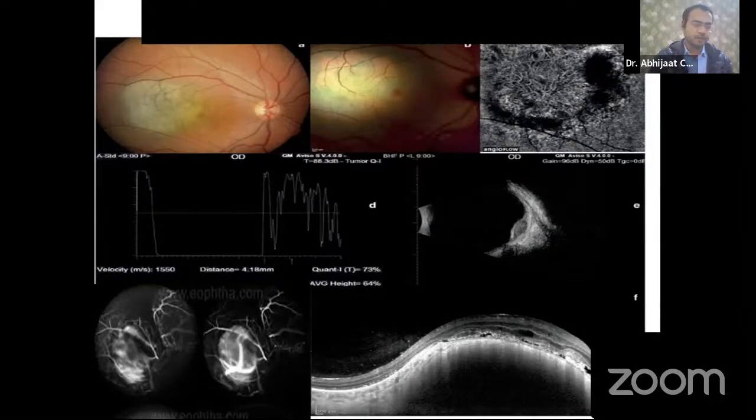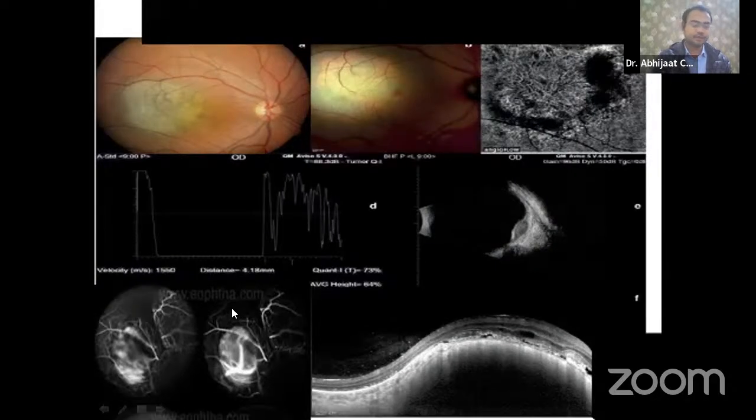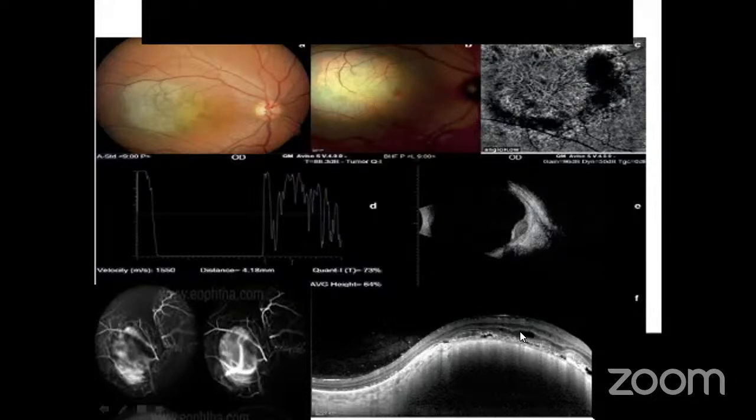In cases of choroidal melanoma, on doing the fundus fluorescein angiography, a very characteristic sign is seen, which is known as the double circulation. The image here at the bottom shows the double circulation, with simultaneous fluorescence of the retinal and the choroidal vasculature. We also see some patchy early hyperfluorescence, followed by late staining. OCT shows a choroidal tumor with overlying subretinal fluid and intraretinal cystic spaces. So the next differential would be a choroidal hemangioma.